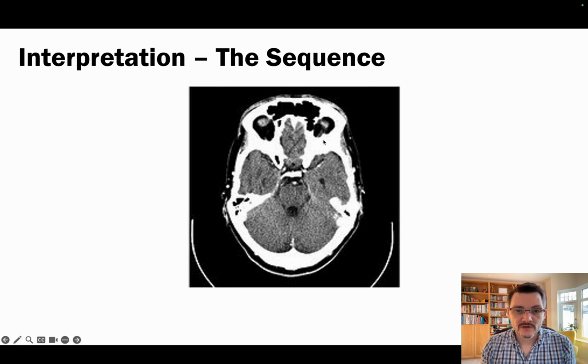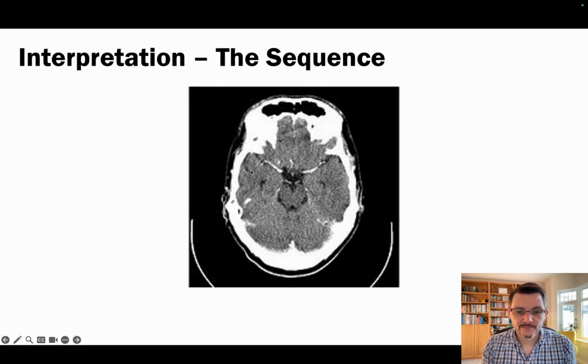We've now got the top of the eyeball, sinuses still. We've also now got more of the cerebellum visible, brainstem here, so this is the midbrain area, and that temporal lobe is really becoming quite evident.